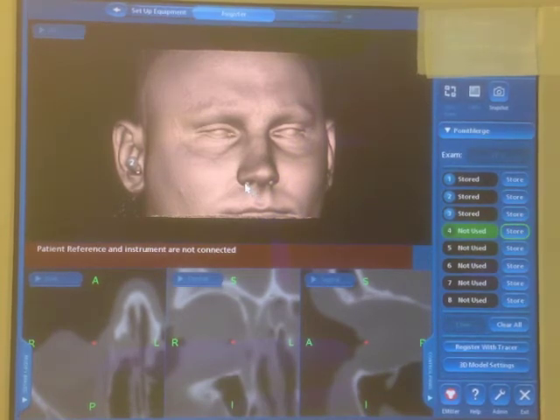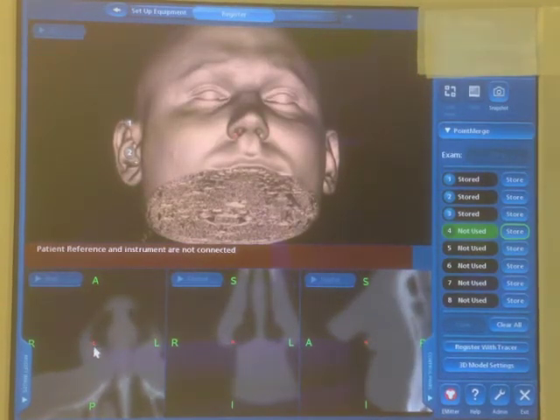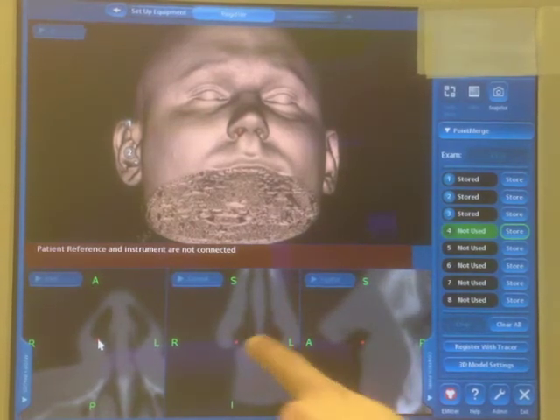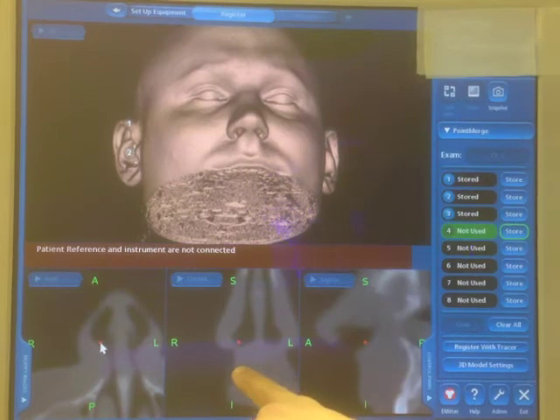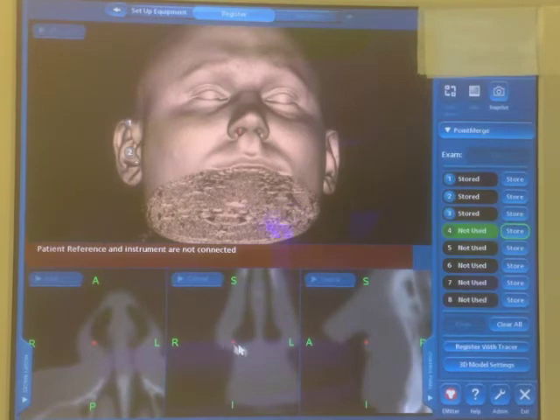The next point we're going to do is the nasal sill, on the internal or medial portion of the ala and nasal sill, and it's right there. What I did is I was working off the axial, but I'm actually watching over here on the coronal, and I'm waiting to see this turn into a solid bar inferiorly. Once I see it turn into a solid bar, I mark the medial point at which the ala and the sill come together, right there.